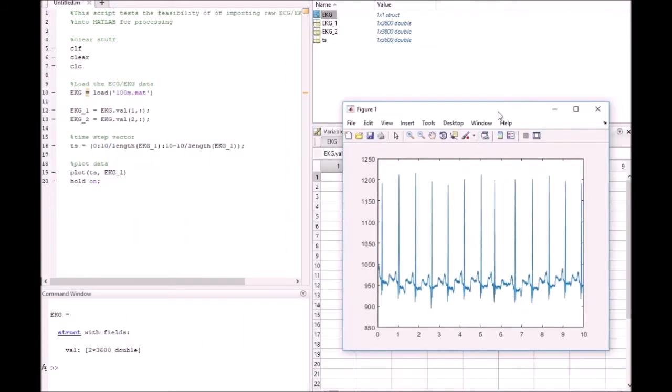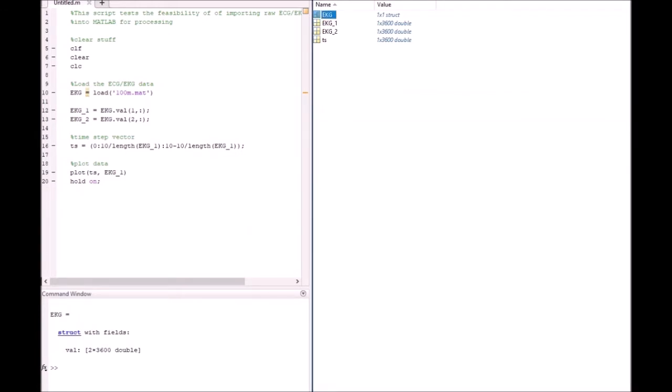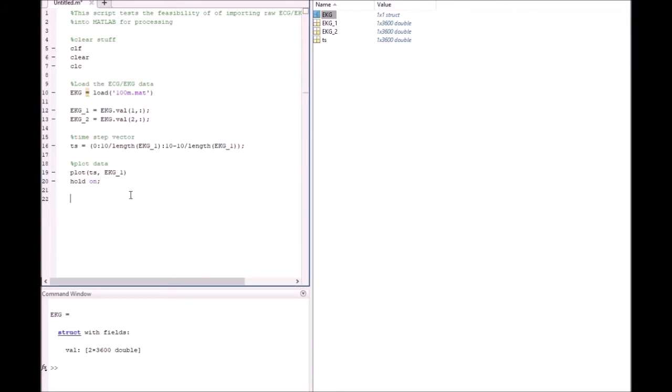So what you can do with this is, now that we have this, we don't need these anymore because we know that that's a struct. We know it's a struct. Okay, and so we're going to go down here, and now we probably should title this, actually. I'm going to title this real quick.